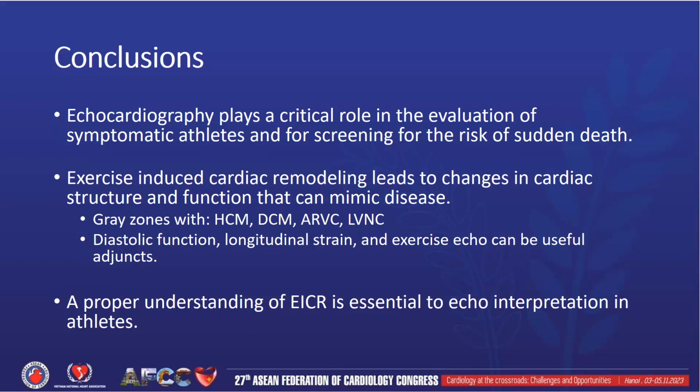And then a proper understanding of exercise-induced cardiac remodeling and the physiology that occurs in that setting is essential to echo interpretation in athletes, and really trying to understand who the individual before you is, what type of exercise they do, how intense it is, how long they have been doing it, and is that exercise exposure enough or capable of causing the changes that you're seeing on the echocardiography in front of you.